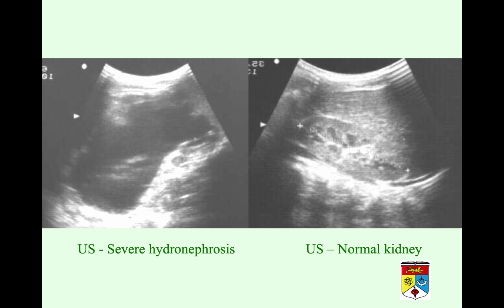Okay. Now, abdominal mass. You palpate and you feel there's a mass, for example, on the right side. Okay, ultrasound. When you do ultrasound, you see this is quite a huge fluid-filled cavity. So where is this actually? By anatomy, we know that this is at the region where the kidney should be, but we do not see a normal kidney. So that means this kidney is abnormal and is fluid-filled, which indicates severe hydronephrosis.